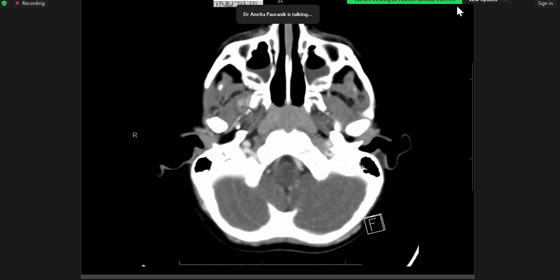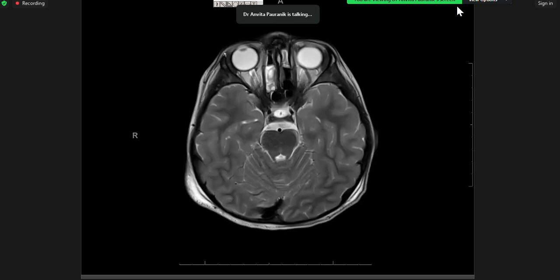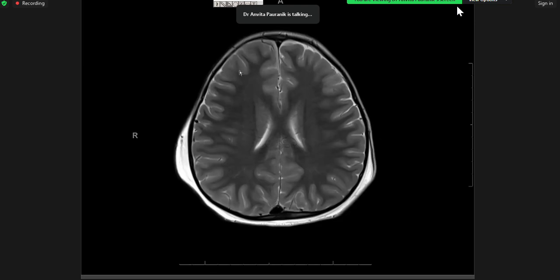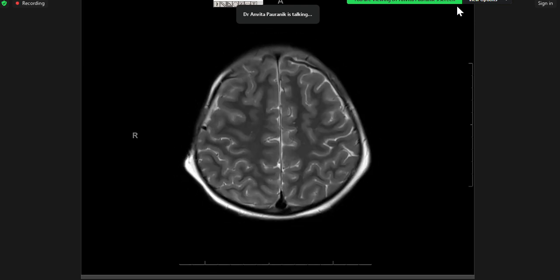And interestingly, this patient did not have an immediate MRI at all. He went straight to the OR, because the clinical story was so obviously convincing, and the surgeons saw such a big collection, and there was so much mass effect. So he went straight to the OR, and you can see the MRI with some post-surgical changes. That collection was removed. It was drained. I will show you the diffusion also shortly.